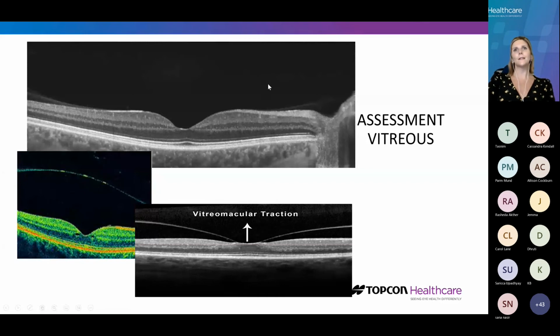Okay, we can't see anything else in the vitreous up here, but what we can see is our normal retinal profile. Important also, just while I've got this image, is sometimes here, you'll see that there's this little lip on some patients. Now that can also be where the cones sit that little bit more prominent in that section of the kind of very detailed vision. So you may see that as a normal structure on some patients, but not on others. So just important to point that out while I've got it to visualize.